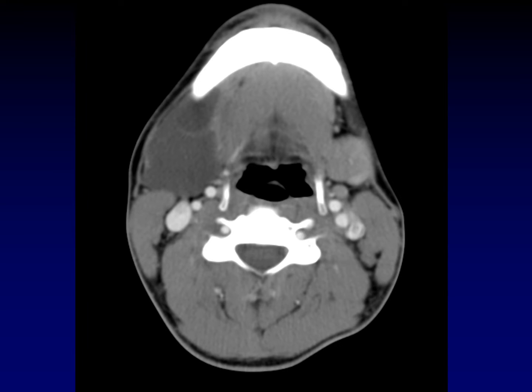Here's an example of a lymphatic malformation. How do we know that this is a lymphatic malformation? Well, most of this thin-walled cystic mass, there's really no perceptible wall. Thin-walled cystic mass is in the submandibular space. You can see it's displaced the submandibular gland that's visible on either side. But that's not all. It also extends forward and wraps around the mandible.